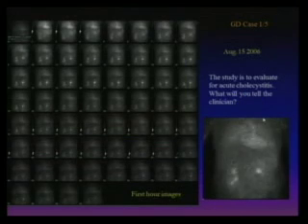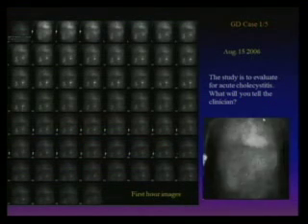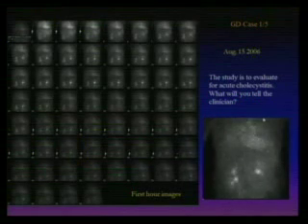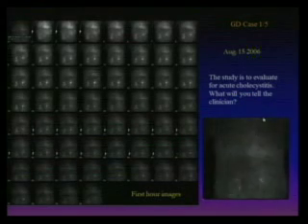Okay, what do you want to tell the clinician about this? You want to rule out acute cholecystitis? HIDA study. Okay. Right upper quadrant pain, has a gallbladder, ate correctly, 4 hours NPO, no morphine prior, everything is correct. Correct preparation. Delayed image is still nothing. And then what do you want to tell the clinician?